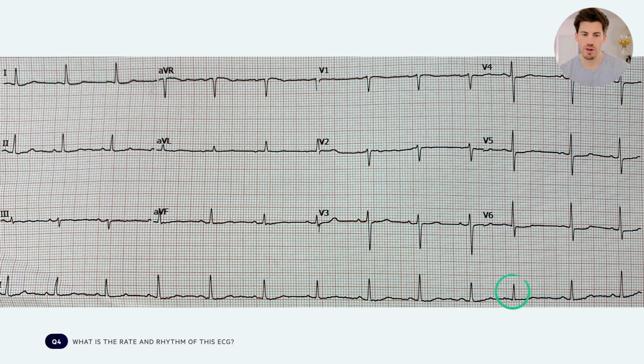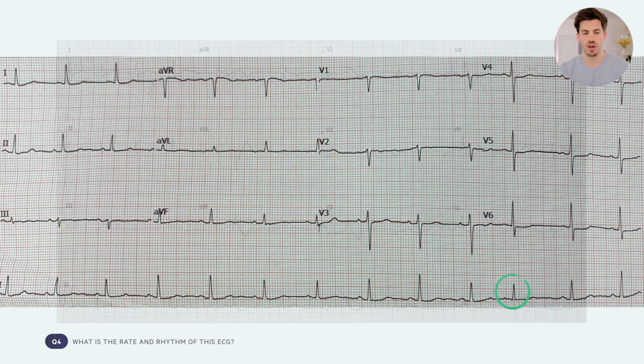So this is actually sinus rhythm with an atrial ectopic because there's an abnormal P wave occurring early and then a compensatory pause. And this just shows you these can be very normal ECGs that otherwise appear normal. And this is why it's actually a regular rhythm, but we have this extra beat. So technically, this is sinus rhythm, not normal sinus, because there's an abnormality that we found in the atrial ectopic.